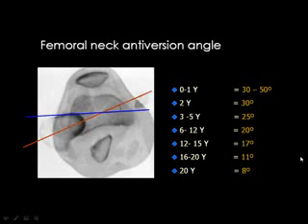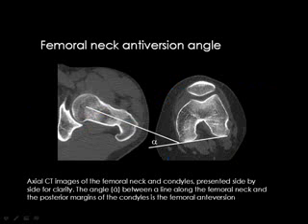This is the normal range of the angle by age. It decreases with progression in age. This is the normal angle at the age of 1 year, and this is the normal angle at the age of 20 years.